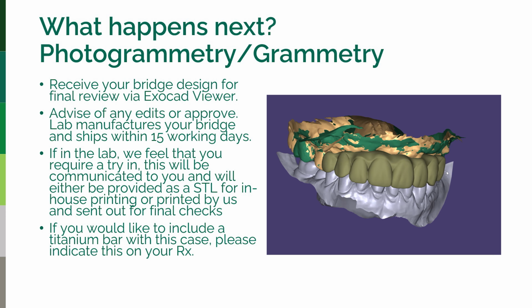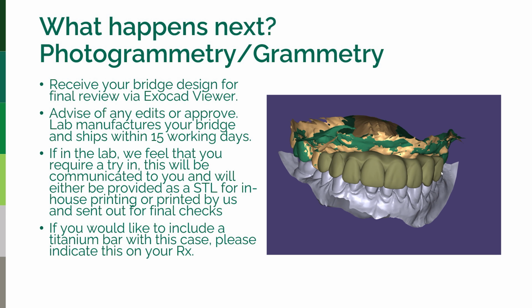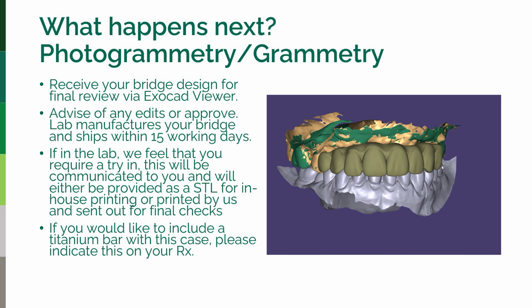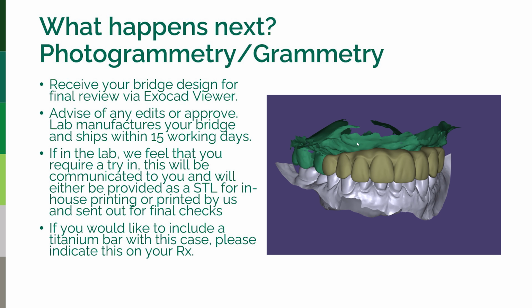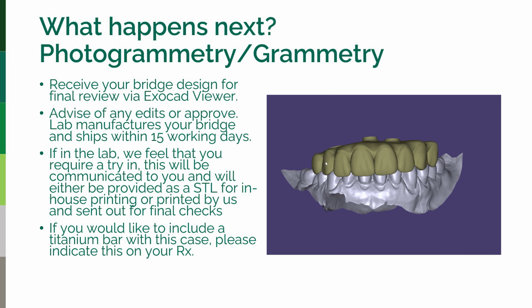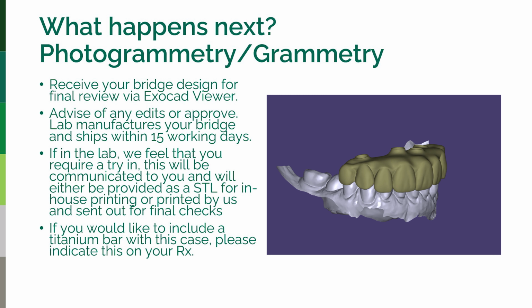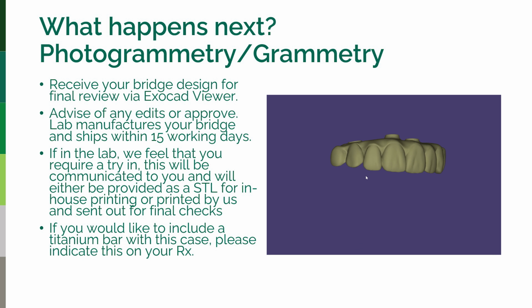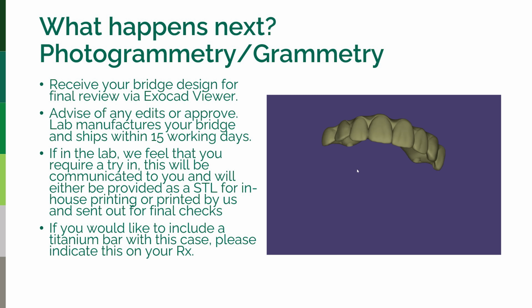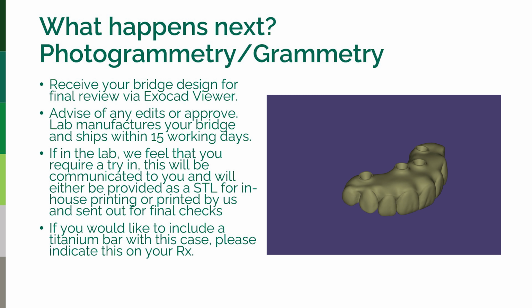What's going to happen next is that once all that data goes into the laboratory, you usually receive an exocad viewer of the design of your prosthesis. This comes on a very simple web link. You can watch it on your phone or on your laptop or your desktop. Here you're going to be able to view that bridge with and without the opposing. If there's adjacent teeth, you can take them off.